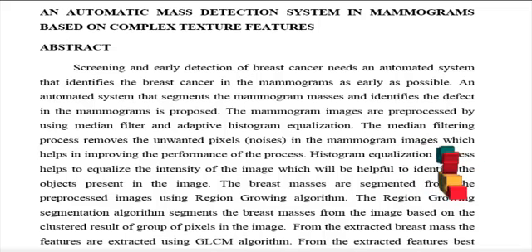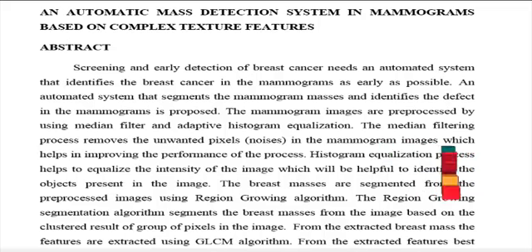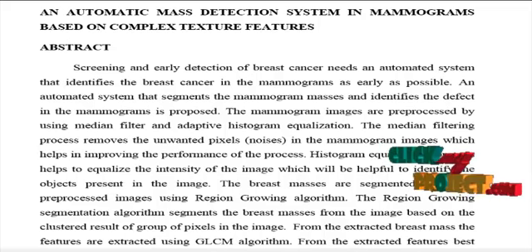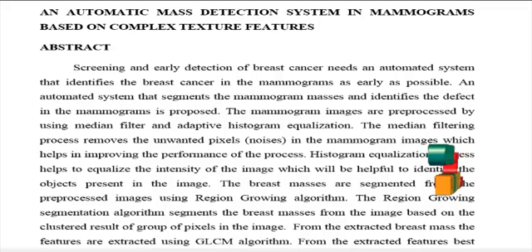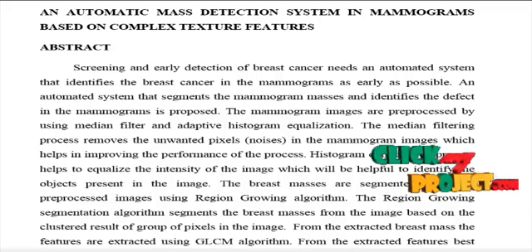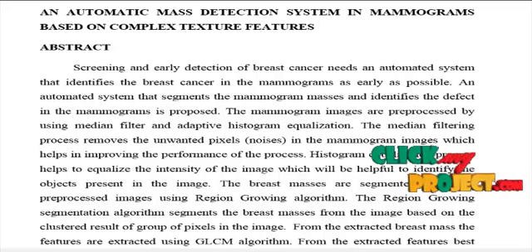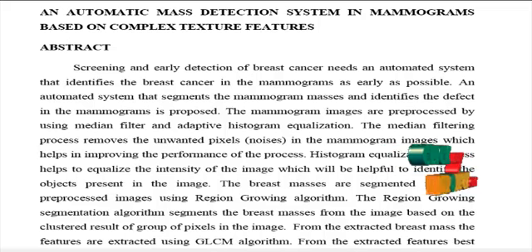From the extracted breast masses, features were extracted from the images using the GLCM algorithm. From the extracted features, the best features were selected using the PSO algorithm. The selected features were then classified using a feed-forward neural network.